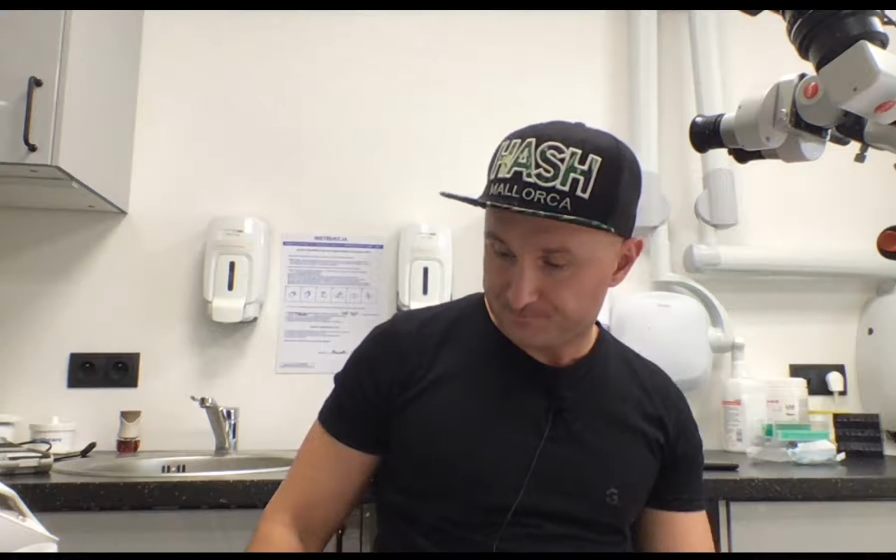So here is the difference, because the effectiveness of the erbium YAG laser will be different for different tissue types. Tissues that have more water will be ablated faster than tissues that have less water. But still, we can work with all tissues in our body, because all tissues have water inside.